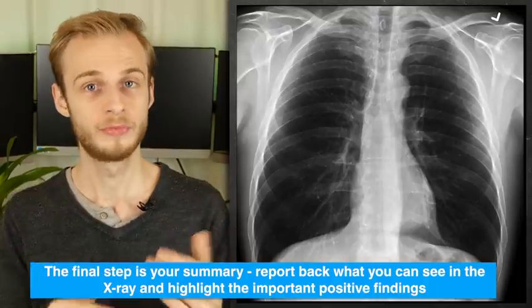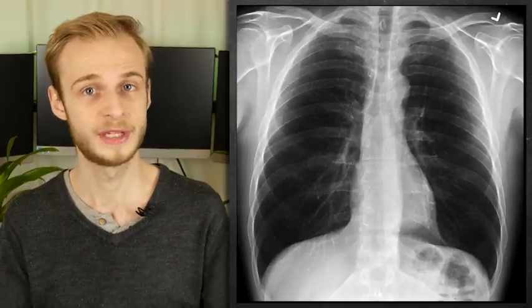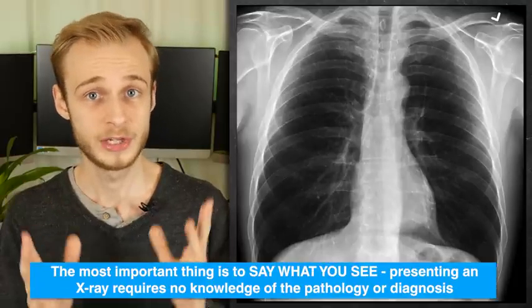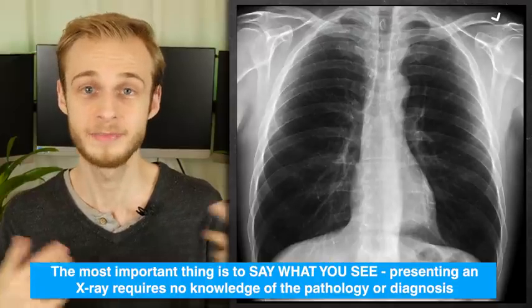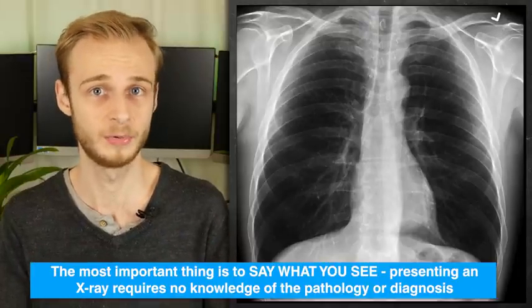It's really important when you're doing this not to skip steps and not let any overwhelming idea you think you have of the diagnosis take you away from your structure. Your job, at least as far as the x-ray goes, is to say what you see. And even if you have absolutely no idea what's going on, as many of us don't, you can still do a good job of presenting the image, which will carry a lot of the marks available when you're being assessed on this.